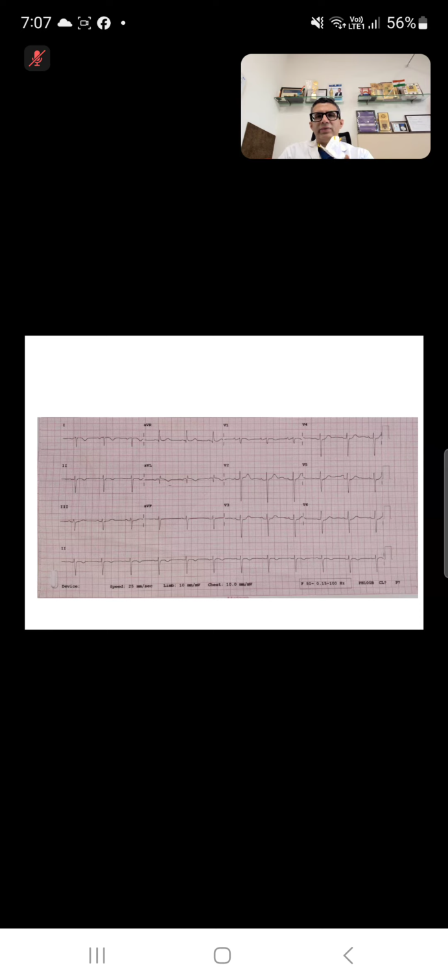Right atrium is now on the left side and left atrium is on the right side. So either it is dextrocardia or it is lead reversal. Those are the only two conditions in which you can have the P wave reversal. Otherwise, in all other conditions, the P waves always follow the conventional rule. That is, L1 is positive and aVR is negative. So is it clear for everybody?